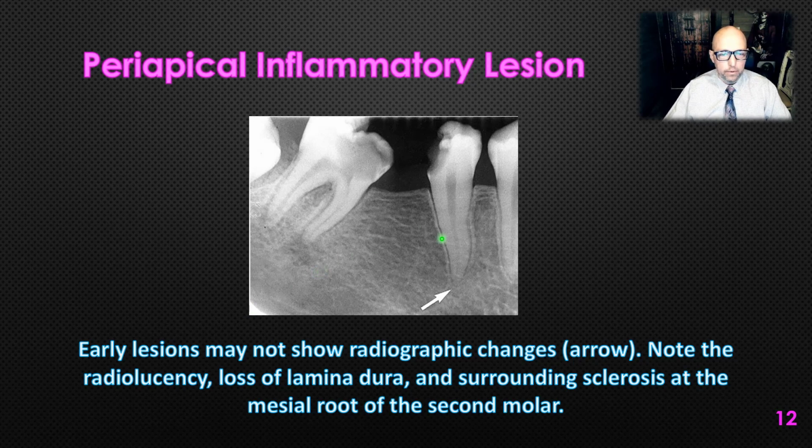This just shows an example where you can have an inflammatory lesion, you can have symptoms, you can have periapical periodontitis, and not even see any radiographic changes. So, assuming they did the vitality test, obviously we see this big missing portion of the tooth, likely invasion of the pulp space. They did the vitality test, it's non-vital. Did a percussion test, the patient is really sensitive, so they're diagnosing periapical periodontitis, but that is a clinical diagnosis because radiographically, you don't see anything around the PDL space of that tooth. It looks uniform, it looks normal. I mean, maybe you could argue there's a little bit of widening, but that's within the range of normal variation.